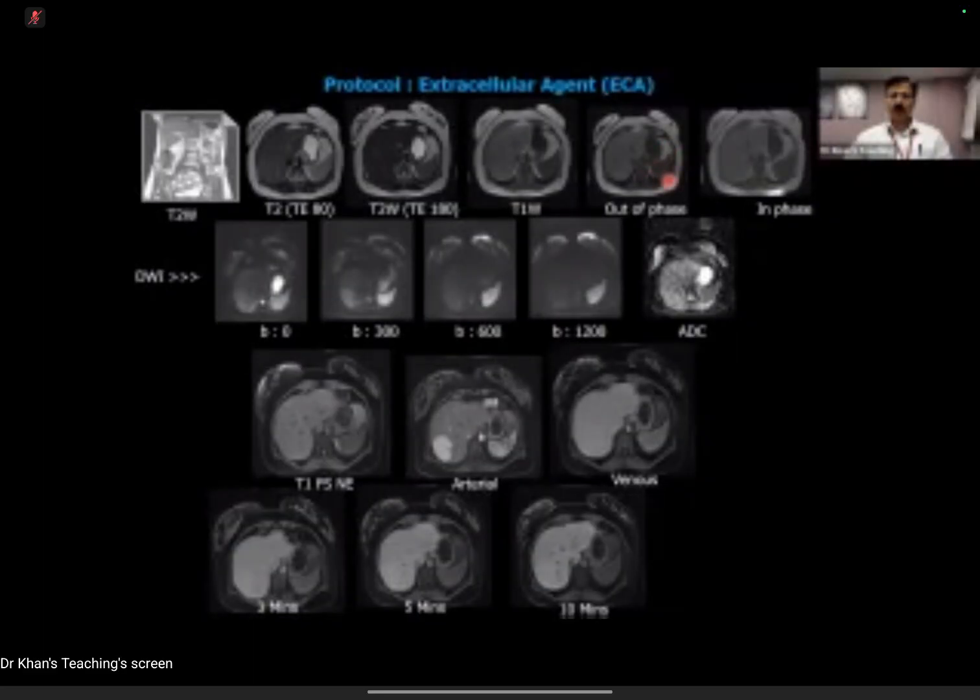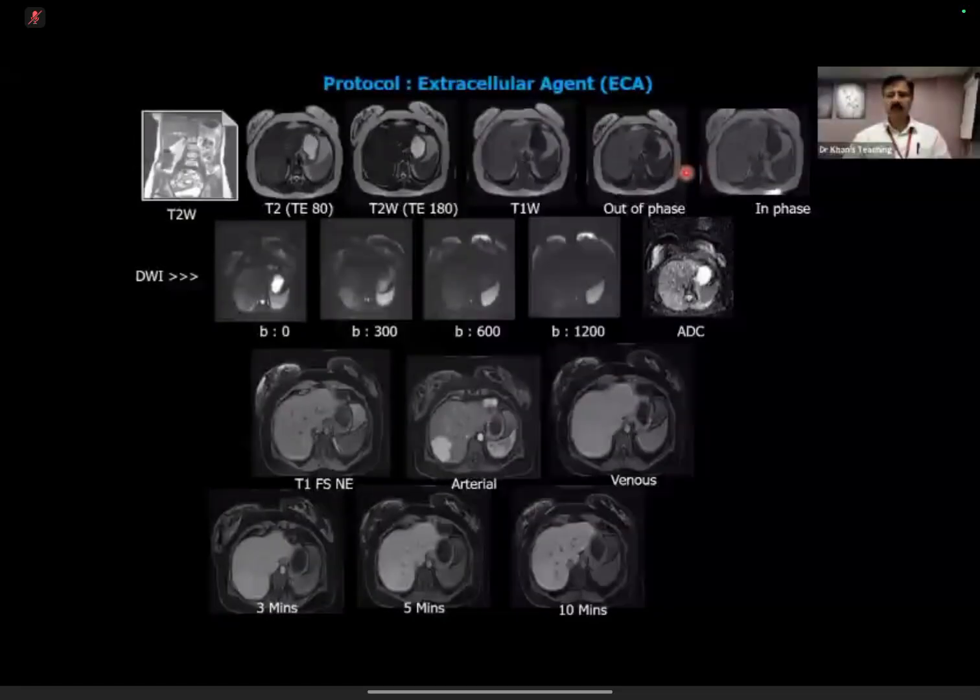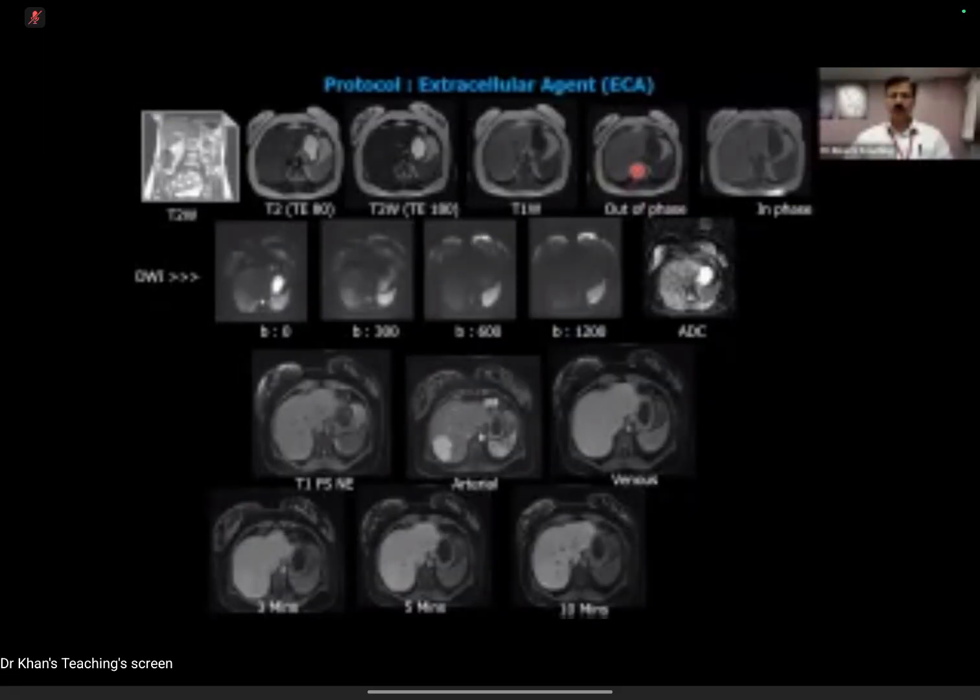For example, around this spleen, there is a black line. Around this liver, there is a black line. This is the interface between this fat and the viscera. This is known as India ink artifact or etching artifact. So you have to develop your eyes on this, and the examiner is going to just open it for you, and he or she is going to expect you to pick up that this is an opposed phase.